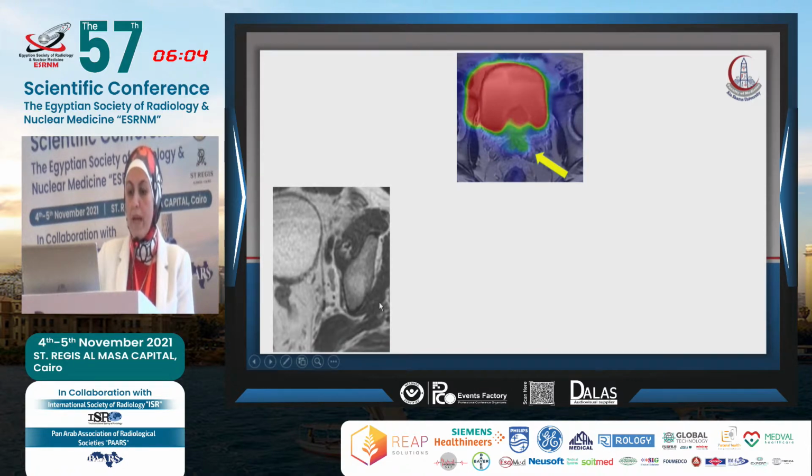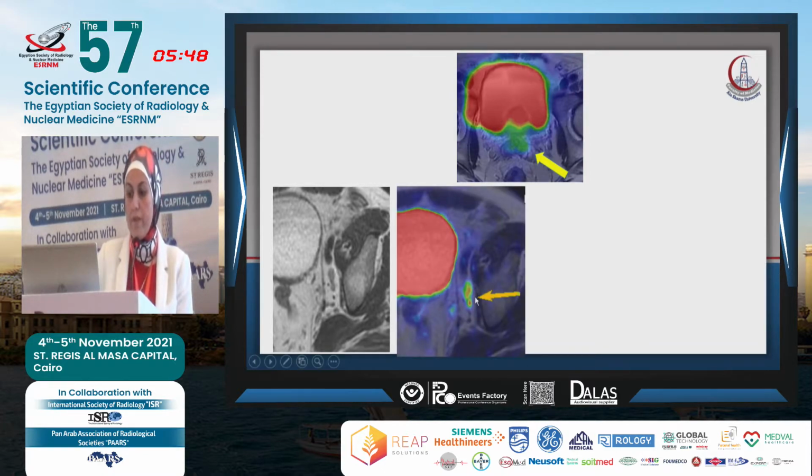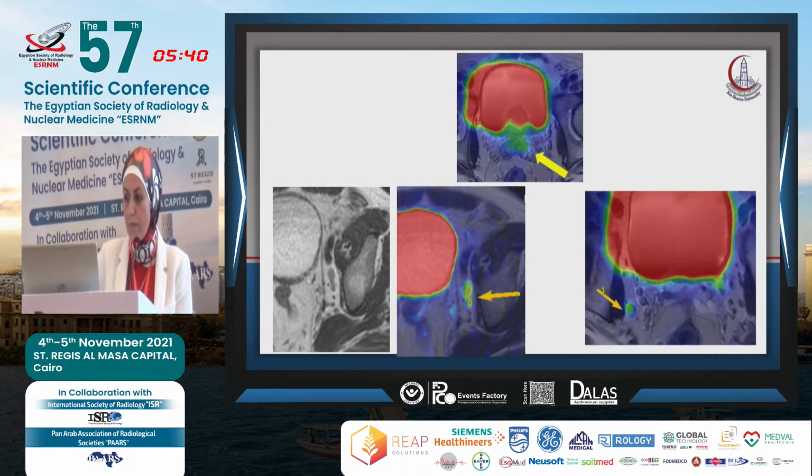What about these small pelvic lymph nodes? Are they metastatic, or just incidental small lymph nodes? On conventional MRI alone, this is a difficult question to answer, because they are small and more or less appear homogeneous. When we performed the fused PET MRI, we noticed increased uptake, and this upstages these lymph nodes to true metastatic lymph nodes. There is another suspicious metastatic lymph node at the right pelvis, which appeared morphologically suspicious on MRI because it is globular, and it also shows increased PSMA uptake over here.